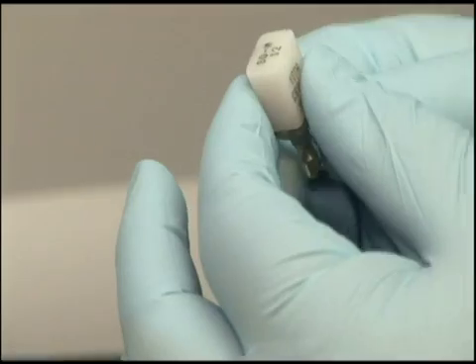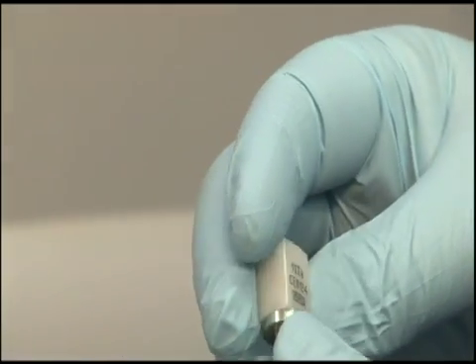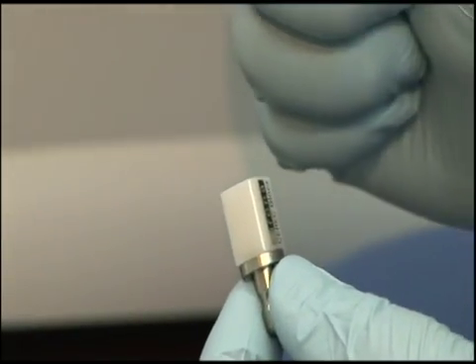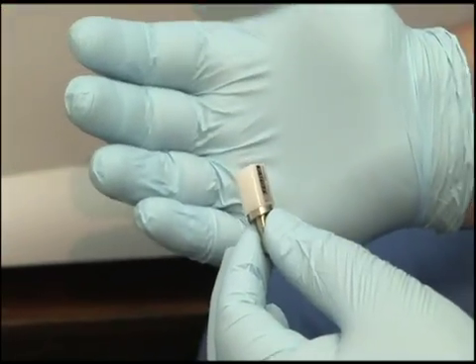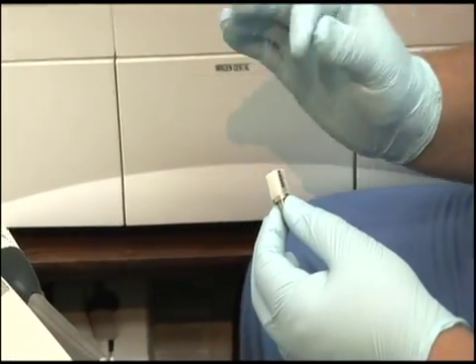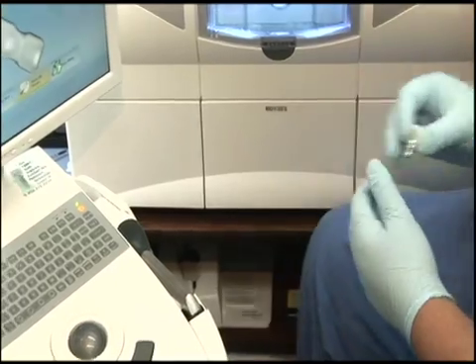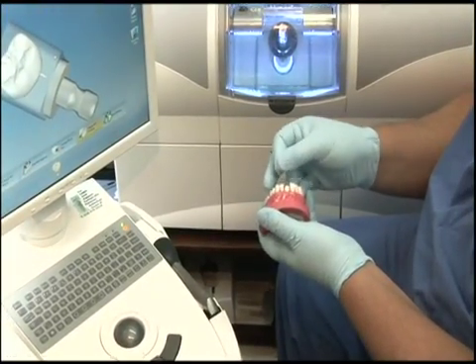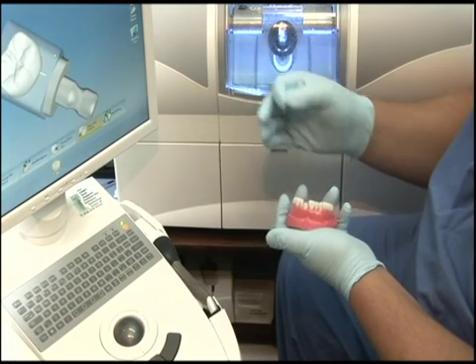One of the problems that we had in the past as dentists with very aesthetic crowns or white colored crowns is that the way they were made is we would take the impressions, send them off to the laboratory, would create a model of the teeth out of stone and then paint the porcelain on with a powder liquid mixture. They would paint it onto the model of the tooth layer by layer. So for example, they would paint the porcelain on layer by layer, and then they would bake it, and then they would paint some more, and then they would bake it.